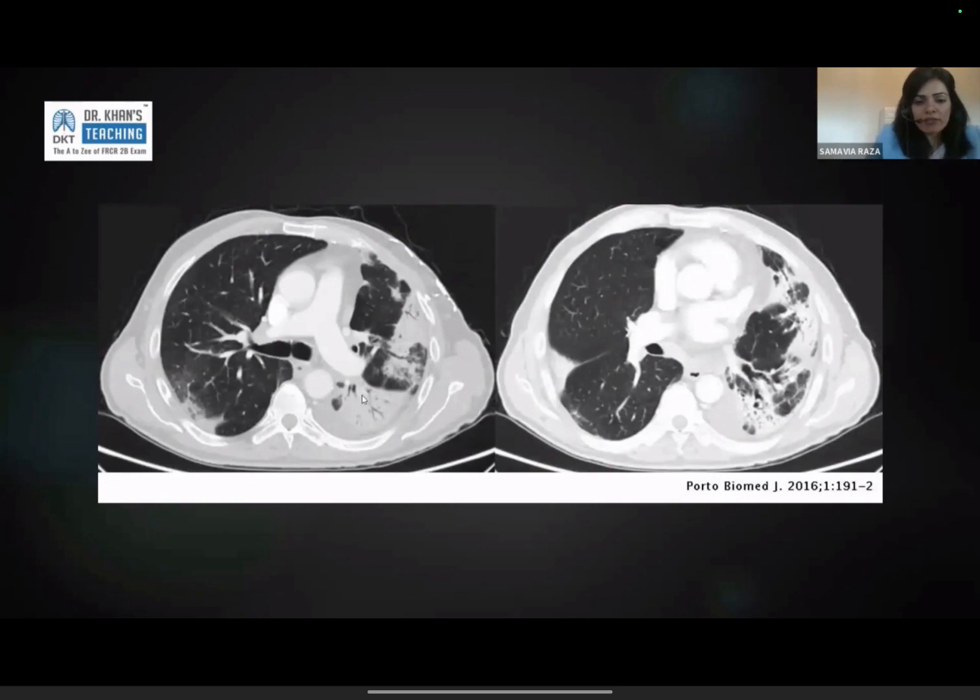That's the evolution of it. That's the acute presentation of it. You can have pleural effusions, but that's usually a reactive pleural effusion. It can confuse you a bit because you start thinking down the infection line when you see pleural effusion. But you see bilateral subpleural bronchocentric consolidation with air bronchograms that over time, weeks to months, will start evolving into distortion. So you start seeing that irregular pulling of the bronchi, you see the irregular squiggly margins.